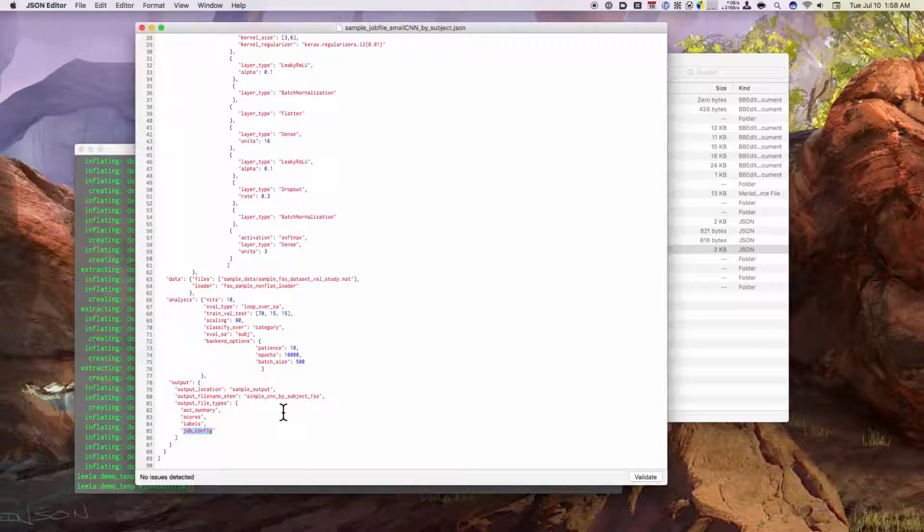And also one thing we like to do sometimes is spit out a copy of this job configuration. The only reason we want to do that is basically so that we have a copy of the configuration next to the output data named the same way, so that it's pretty foolproof. Hopefully, even if you change your job config, if you leave this parameter in place and run it again, you'll get a copy of whatever job config was run alongside the output, so that it helps you keep track of what job configuration was used to generate your output data.